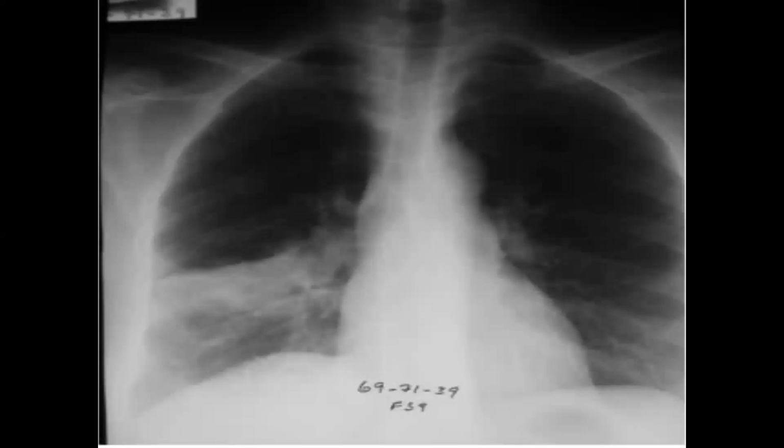So let's look at the X-ray. One thing we need to take note of is, are you able to see the homogeneous opacification? Yes, so immediately you see that you can already start thinking of pneumonia. And you're able to see that the affected lobe has still retained its volume. This is why I said that in children sometimes you may see a rounded mass maybe here, which a person might start suspecting is cancer, but it's not. That's how sometimes it may present in children. Then it often shows air bronchograms. In this image it's not so clear, but I'll show you in the next image.